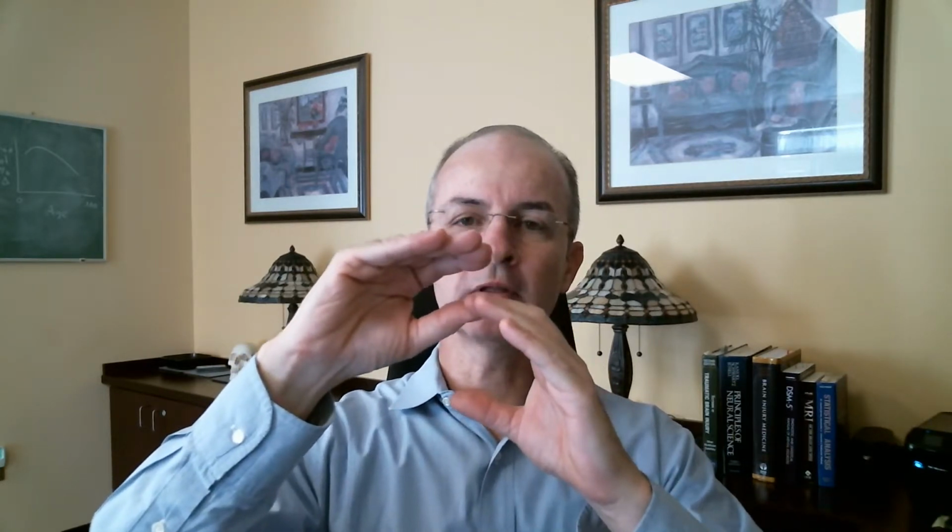And this patient also had traumatic brain injury, and the ventricles expanded because the brain tissue around the ventricles was shrinking. And that's what happens with brain injury. When the brain tissue shrinks, the ventricles get larger by default to take up the extra space in the brain.